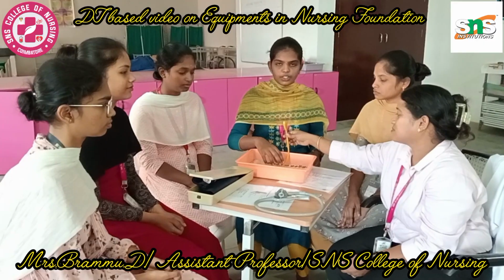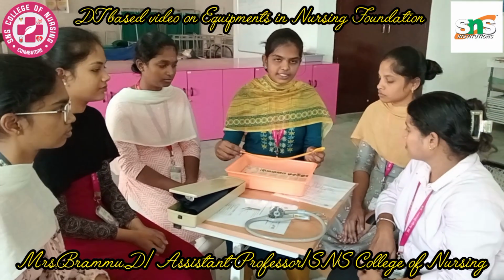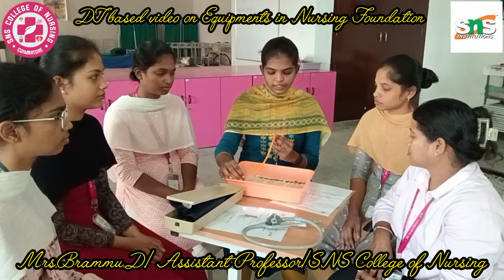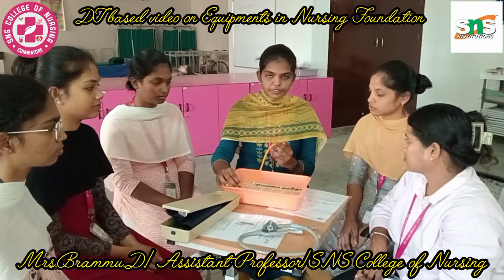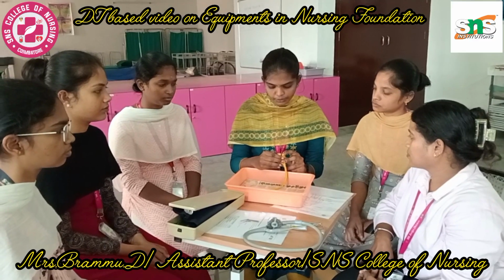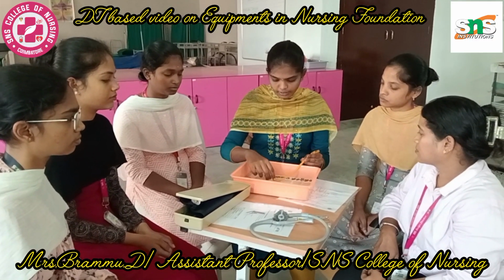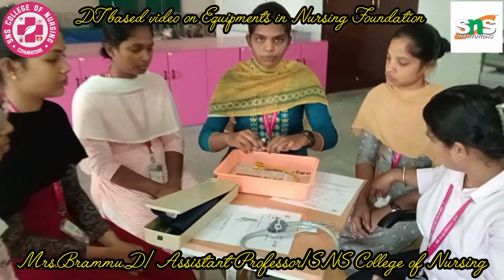Soumya. Good morning everyone, myself Soumya. I am going to show a Foley's catheter of size 20 French or 6.7 millimeter, in which the outlet of urine at once is 30 to 50 ml. So this is the balloon. This is the balloon port, and this is the urine drainage port. And following that, this is a balloon. So I'm going to demonstrate how the balloon works.